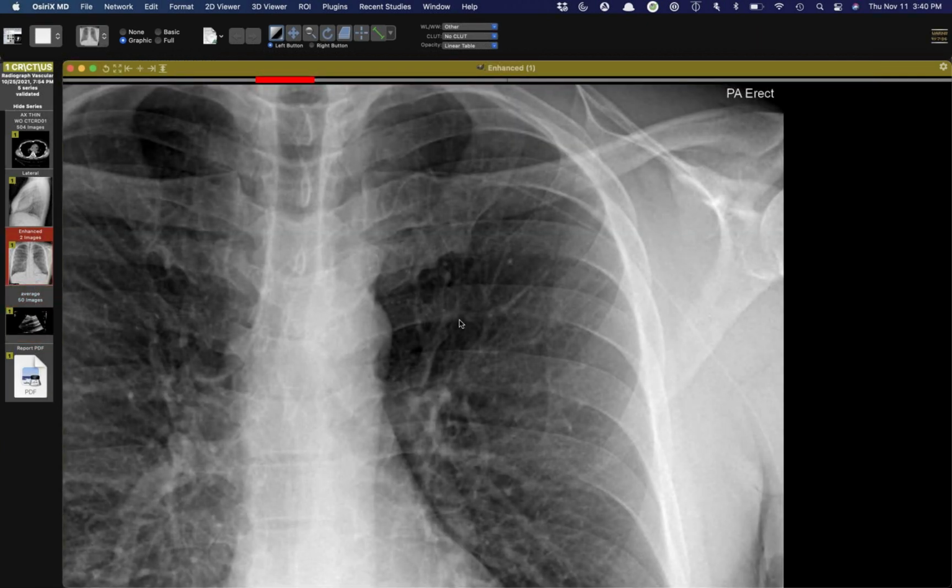So Travis, is his thought that the fact that it's sort of wavy like that is because it's adherent or fixed versus the normal flow, it should kind of float to where it's like under normal tension? Yeah, exactly. I don't know. I wish we had a CT in this case, but I have never even thought about that as a diagnosis before that you can make on a radiograph, but he was right.